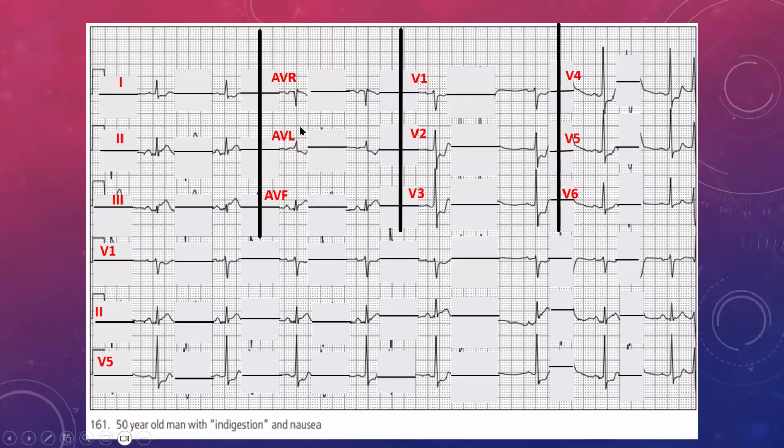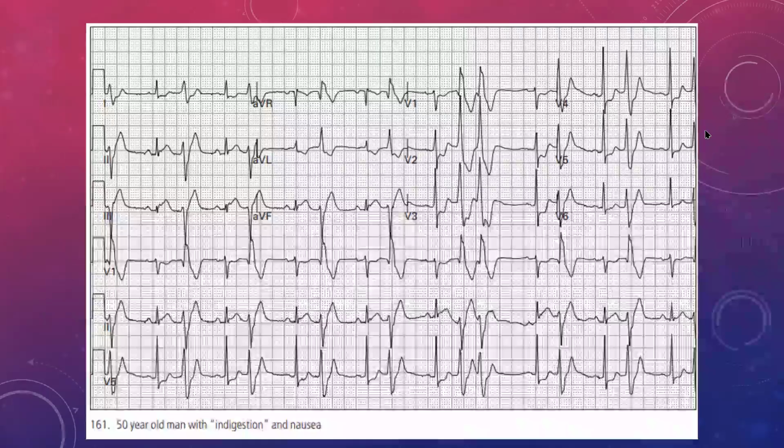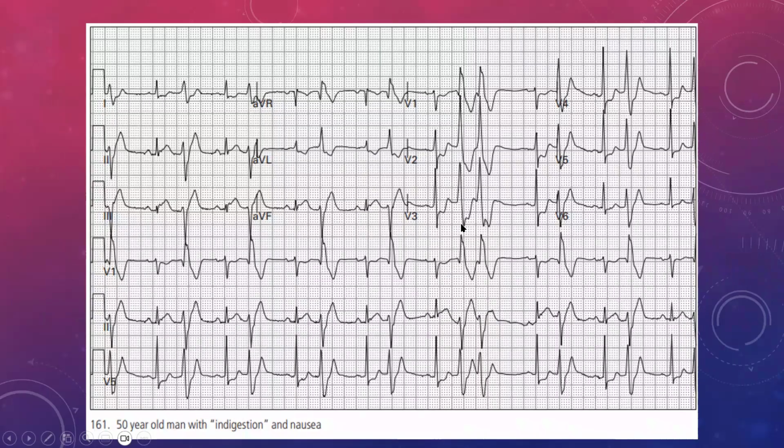So somebody is going to come and take over this patient, get them into ICU, possibly get them thrombolized or to PCI. So I hope you understand that the most important part is to actually make some sort of diagnosis on a busy ECG, even if you can't make a complete diagnosis. The problem with us is that when we see this, we panic and we shut down.